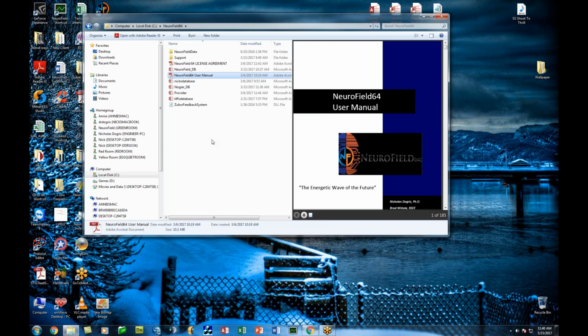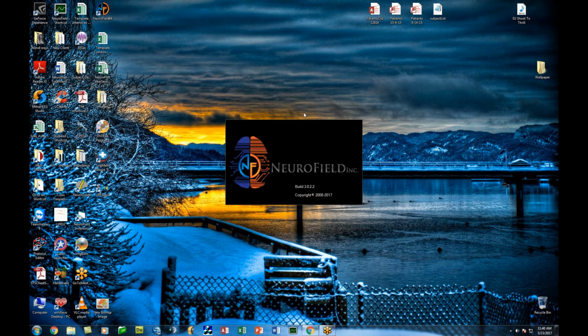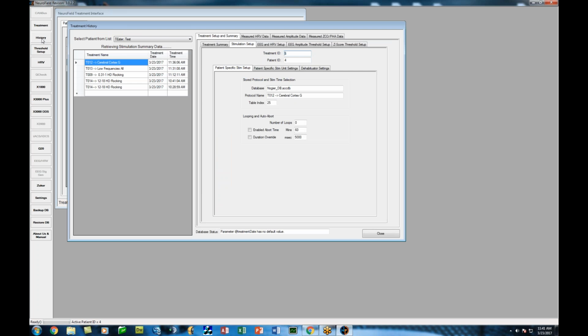Nick, it's Barry J. Hey, Barry. You were talking about the session by session history. Is there a way to print that out? Yes, there is. So once you get that, okay, let me go over here. We should be able to plot the data, and let me get in here real quick. So if I go to my patient, I select my patient, I go to history, and then this is everything that we did during these 2 hours here.